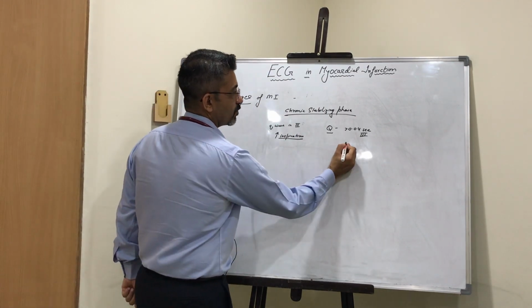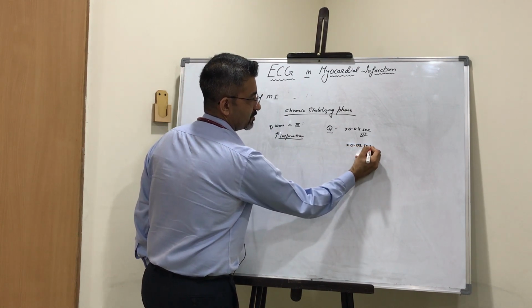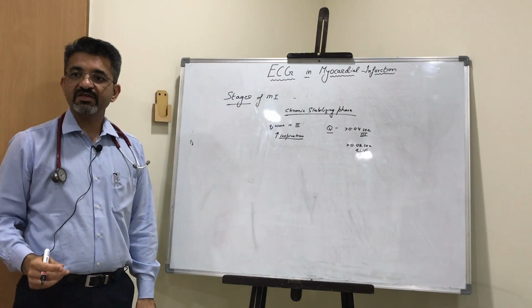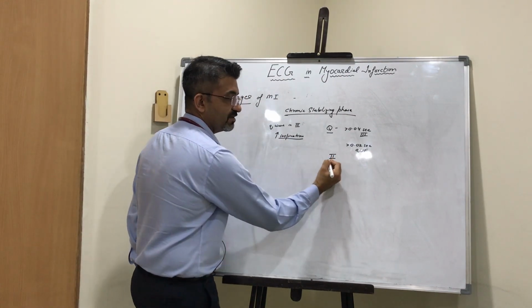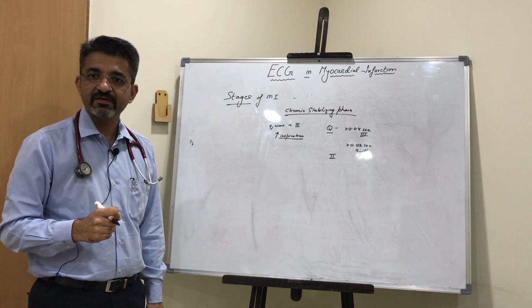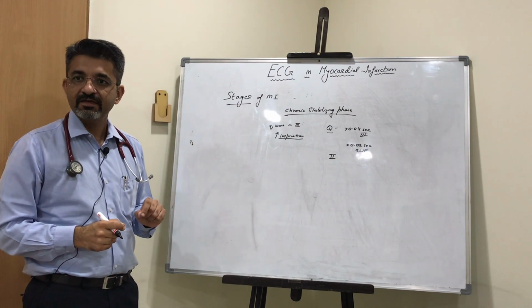If it is more than 0.02 seconds in AVF, it means the patient probably suffered from an old MI. Lead 2 will never have a Q wave. So if you have the tiniest of Q wave, you should always be skeptical that probably this patient suffered from an MI.